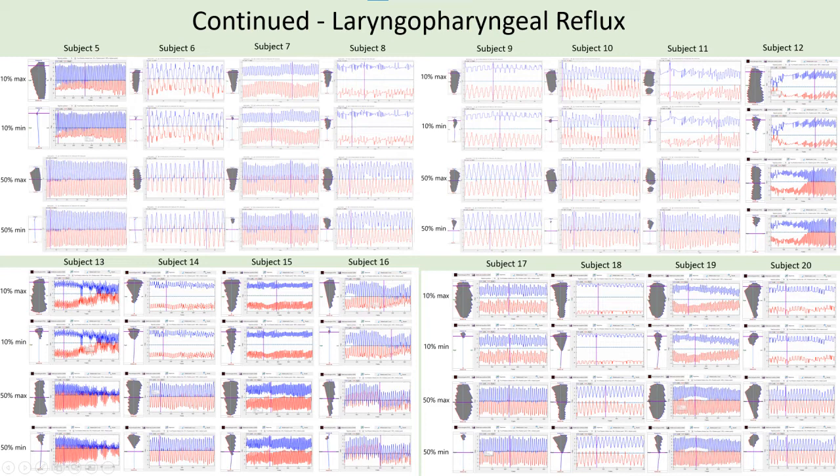This method of reproduction on pixel level of the glottis is interesting, and any percentage of distance from the rear part of the glottis can in principle be chosen, not only for laryngopharyngeal reflux, but also for nodules, polyps, and malignancy. This gives exact information on the glottis at a selected precision in pixels that can be used for quantification.